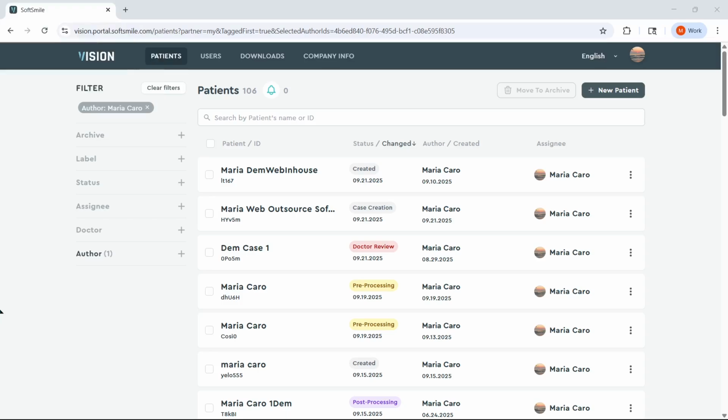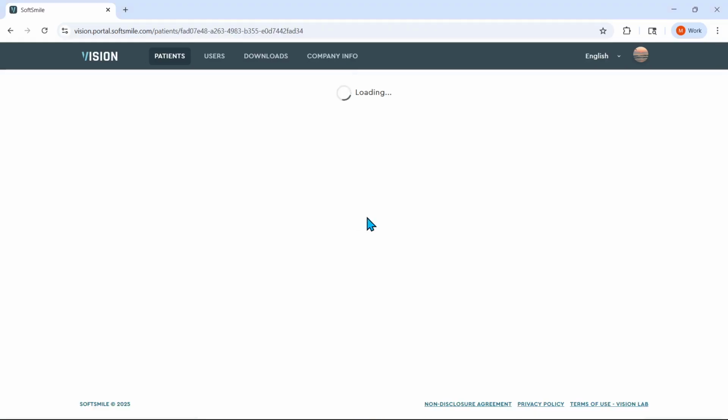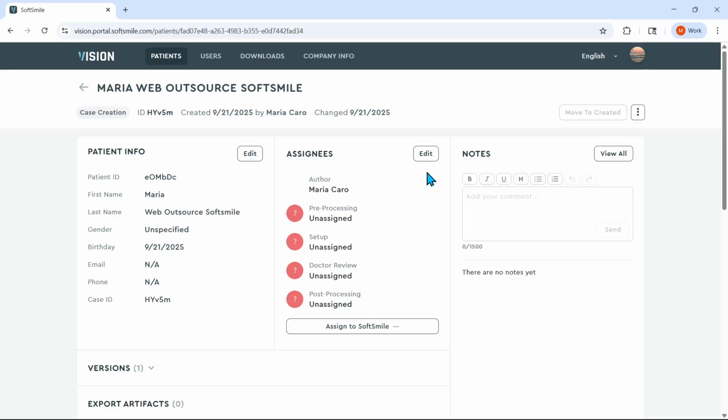Okay, so you should be seeing my screen with all the patients, and we're going to cover assigning the case to SoftSmile. So I'm going to select the case that I've already created. If you need to go through the process of creating a case, we do have another video of that within our YouTube channel, so check that one out. I'm going to select the case that I've created, where I entered the patient's information and uploaded the STL file. So now we have to assign the case to SoftSmile.